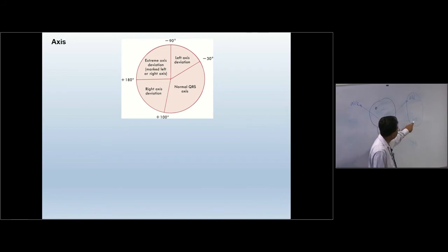So lead 1 will draw lead 2's picture, and the best waveform will come to lead 1. When you look at the ECG's leads 1, 2, 3, you will see all the tall R waves are now in lead 1. And now when this axis rotates that way, the opposite side lead will be lead 3, and it will show deeper S waves because electricity goes that way now.